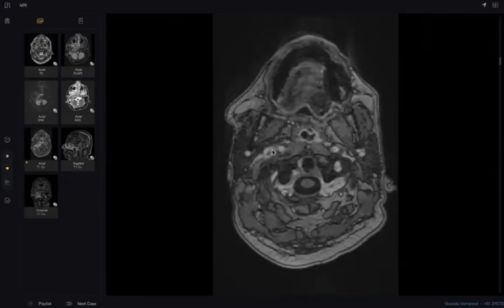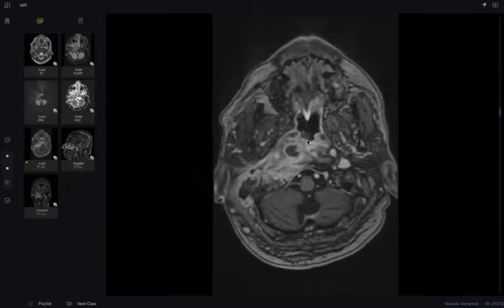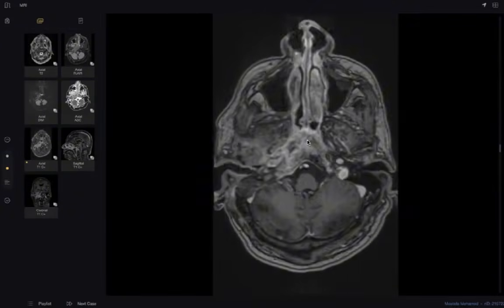I would like to look at the carotid artery. It does show a filling defect that could be a complication of the condition, with carotid artery partial occlusion. Still, I cannot see a definite localized fluid collection. So, yes, there is as well. There is a right-sided fluid collection. I see it.